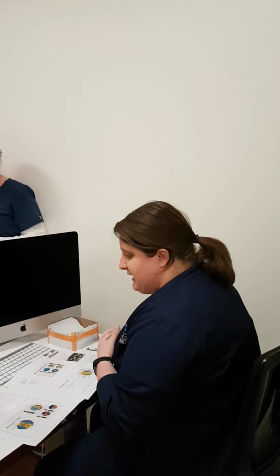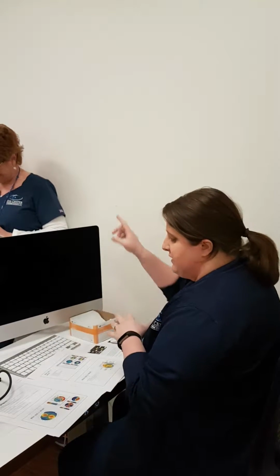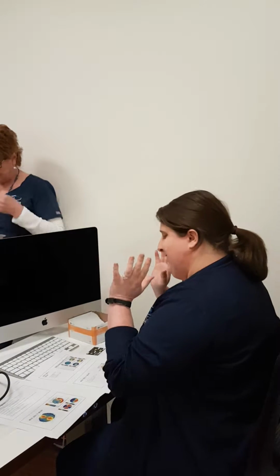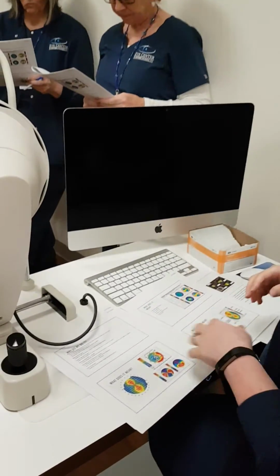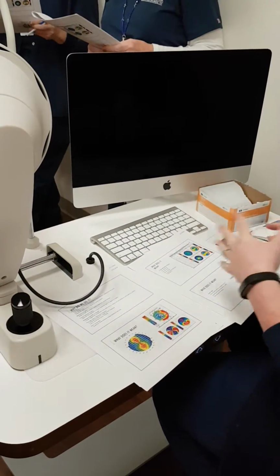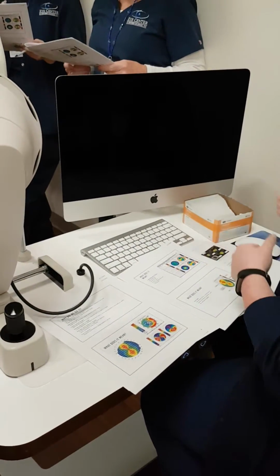What do the numbers mean? Why do we use the reports that we use? If you can look at the pictures there, the first one on the left side is a nice, perfectly symmetrical bow tie pattern. That's what we're looking for in a regular astigmatism. And alternatively, the images next to it are all different forms of irregular astigmatism.